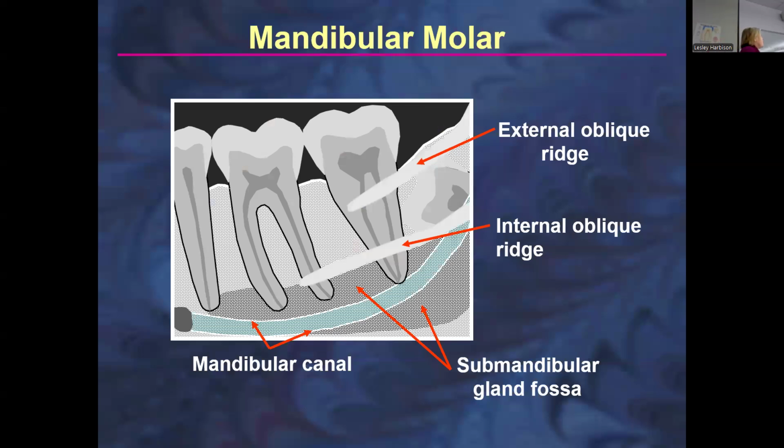And so we have basically more of the same. It's just going to look a little bit different because now you're on a molar shot instead of a premolar. But it's basically the same anatomy. The only thing we're actually adding is now we're adding the external. So we're not adding new stuff. It's just going to maybe look slightly different because now you're looking at it from a molar as opposed to a premolar. So here's another opportunity to think about it in layers.